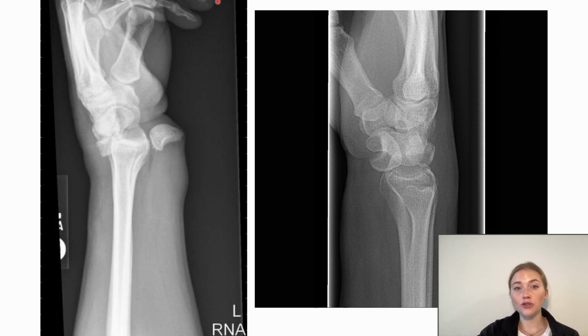In contrast, a true lunate dislocation involves the complete dislocation at both intersections, so with the capitate above and the radius below. So the lunate is left floating unattached to either the radius or the capitate, so there's no cup and saucer. This results in the characteristic spilled teacup sign, where the lunate, shaped like a little moon or teacup in this case, is completely upside down and displaced volarly into the palm of the hand, or just volarly over the wrist there.